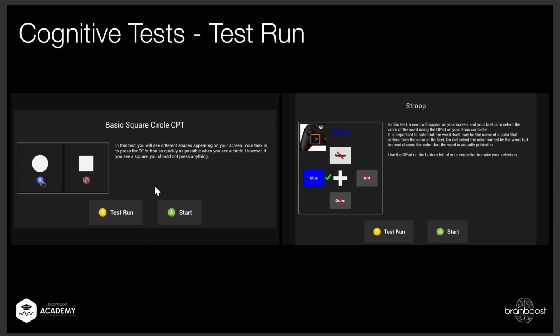If you say, I still don't get the test, press Y again, and you can practice the test a little bit so you can get used to the control. The same for the Stroop test. So for people that know these tests, it is a pretty sweet implementation now. And so use those tests after the update, and that's a pretty cool test. Besides EEG data, you can say, oh, hey, you have a pretty fast reaction time, but a very high commission error, so you make a lot of mistakes, your impulsivity control is a little off, maybe practice a little bit holding back, thinking about should I press yes or no. So this is also a nice update feature.